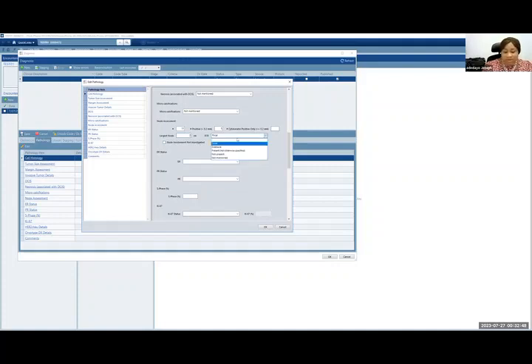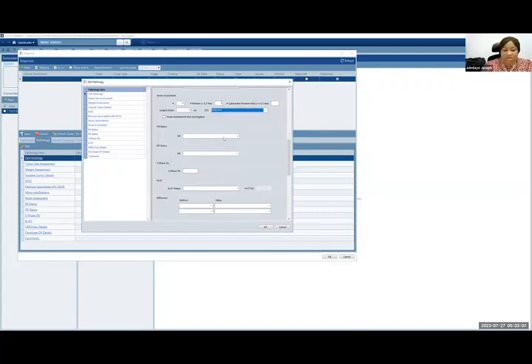Was there extracapsular extension in the nodes? Yes or no? If it is no, it's not present. If it was not mentioned, it is not mentioned. If it was present and not otherwise specified, this is what you select. If it is focal, extensive, you select that. Or if the node involvement was not investigated, you just click on this and it automatically blanks that out, but it lets us know that the node involvement was not investigated. If you don't select this and you don't fill in all this, the assumption is that the nodes were investigated, but you just haven't reported it.